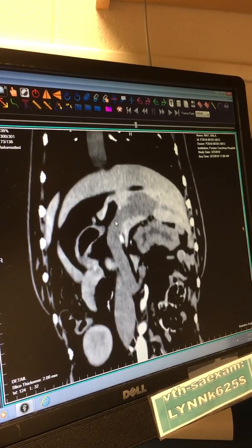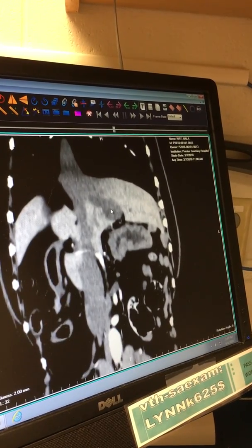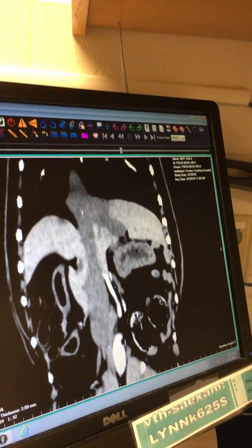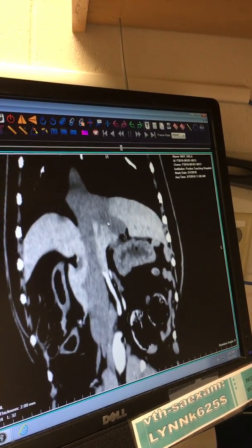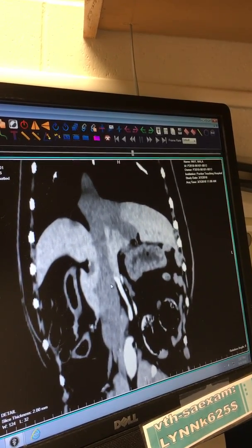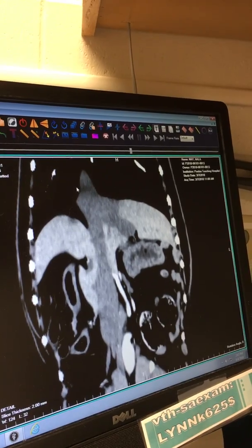But we have this shunt vessel coming off here, and it hits this kind of saccular dilation area because it comes into the left hepatic. Well, it's just an abnormal dilation of the shunt vessel here, and then it connects to the caudal vena cava right where the left hepatic vein drains. So you have this shunt vessel coming in, and normal hepatic venous drainage coming into the caudal vena cava. So you have the portal vein draining into the caudal vena cava. This is the portocaval shunt.